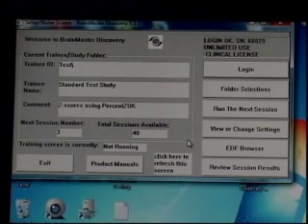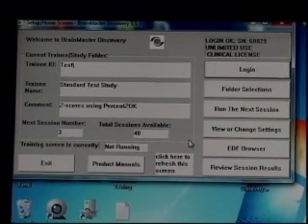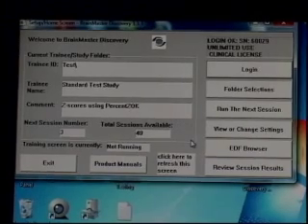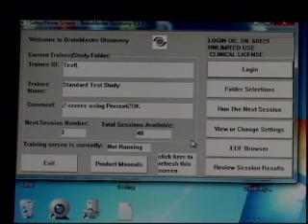Now at this point our device is installed, our software is installed, we're logged in, we're actually ready to begin. The next step would be to go ahead and create a folder for a client. What we're going to go over to start with is just a basic acquisition protocol, so you can acquire data and then you could send it to an expert or a processing center to print a brain map for you. It'll create what's called an EDF file.